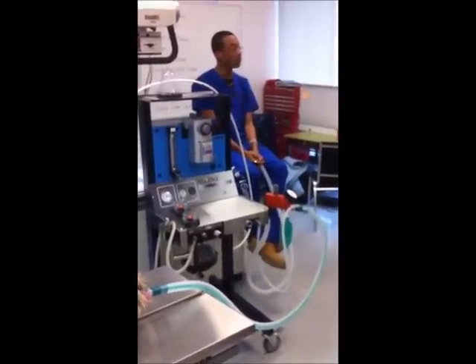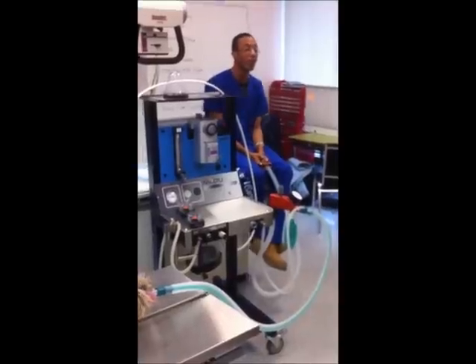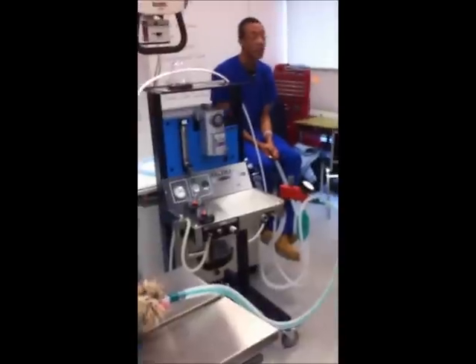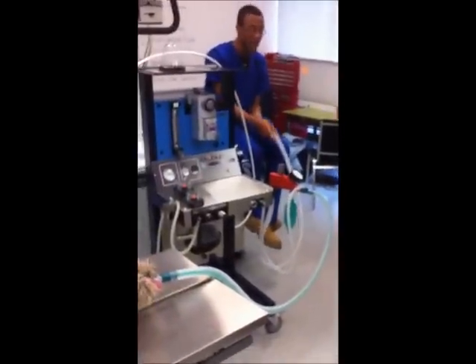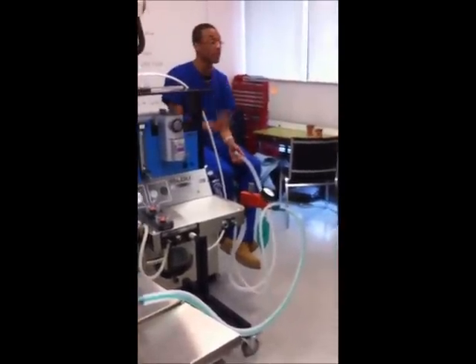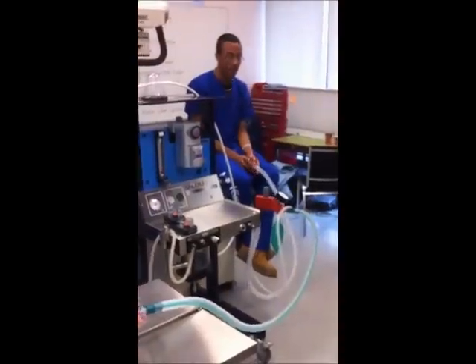After your rebreathing bag, pop-off valve. Do you remember what the pop-off valve does? Controls waste gas. Basically, you can control how much gas is escaping out your scavenger. You do want it open during your surgical process. When bagging an animal, you'll be opening and closing it. We'll run through that in a second.